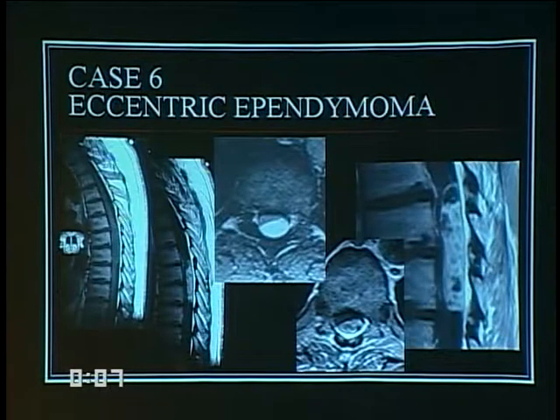On T1, this is a very uninteresting mass. Other than the presence of the mass, it doesn't really expand the spinal canal. With gadolinium, it gets more interesting. Here, a magnified image where it gets more interesting, and this ependymoma pushing the spinal cord ventrally.